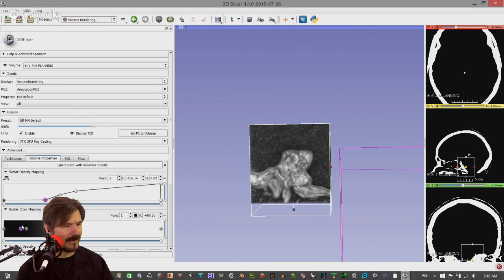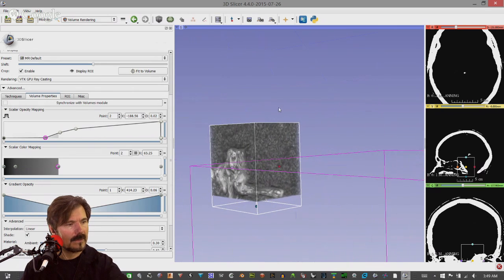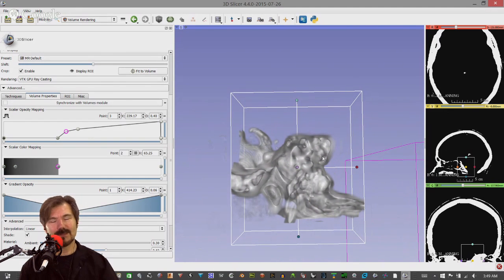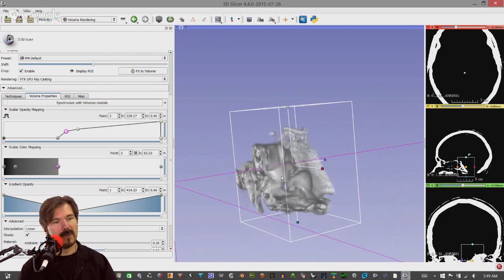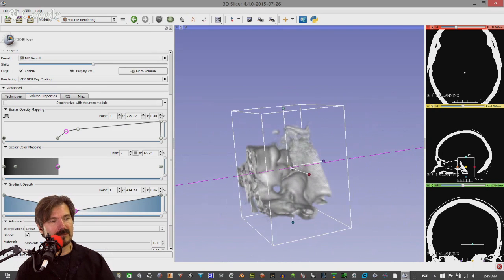We're almost there. What I want to do is, getting there, I want to cause the black to disappear. There. There we go. Close. I'll tell you, we're picking up a part of the bone, but that's fine. I'll load mine up now. Well, I'm assuming the smooth area here. But obviously, if one, I were trained to do this, and two, I had spent more time on it, we could do a lot more.